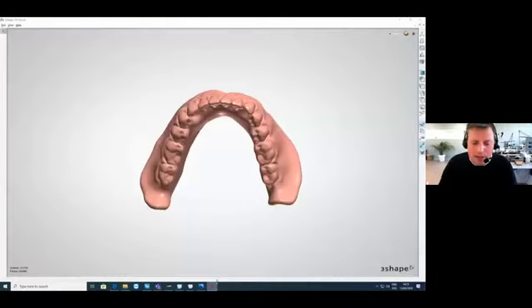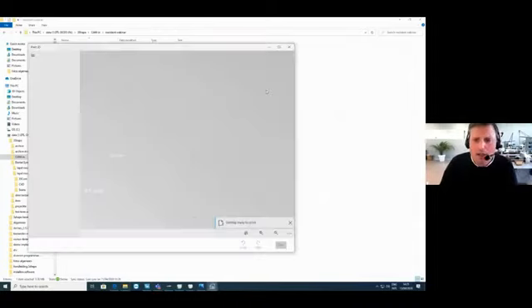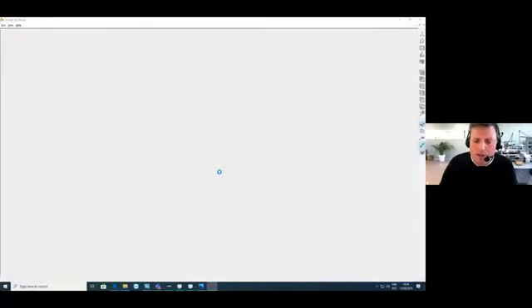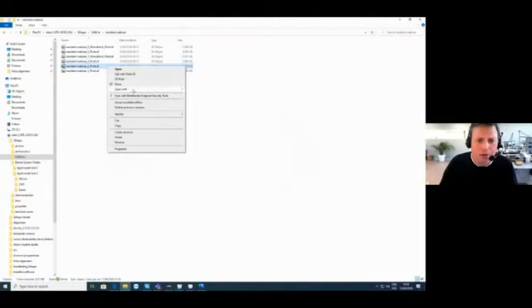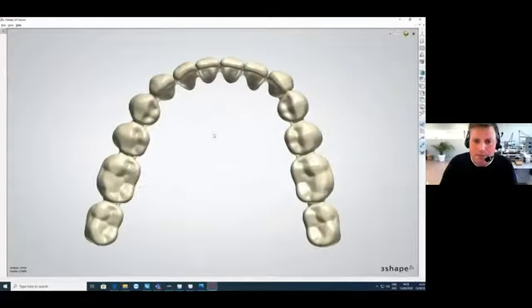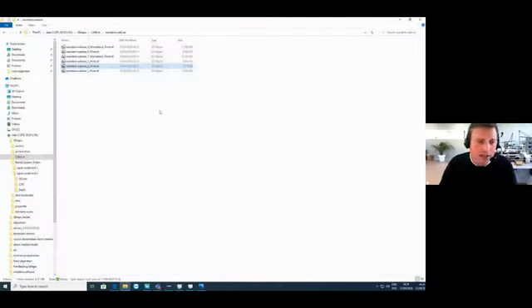That's really easy. So you set up your order like it's already been done for your final denture, and the software automatically makes an order. So it makes a monoblock. I will open this one. I will show you what kind of files. So here you will see the upper base, and you also see the teeth arch that will be created. So here's the lower teeth arch. So all the 4 files are ready to print. You can directly put them into 3DS Print, and Menno will show after me how that works.